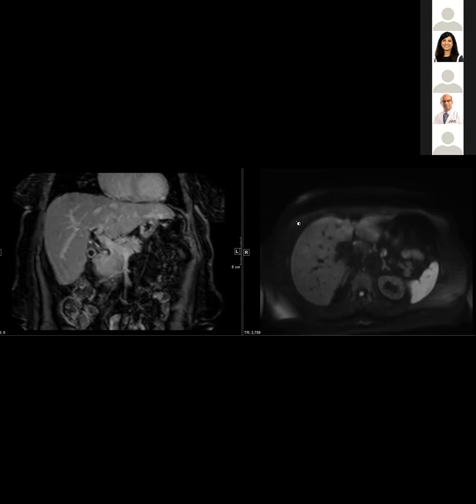I was just trying to explain maybe what the radiologist who interpreted this would have done. Like I said, I wouldn't have passed this case, because, as you said, there are no cystic spaces. I think also typically with adenomyomatosis, you see either the lumen running through that segment, so there's not as much mass effect, or perhaps a little bit of lumen after the segment that's involved. And this didn't have any of that. But for the radiologist who read this study, I could see how in a moment you decide that's adenomyomatosis and you continue.